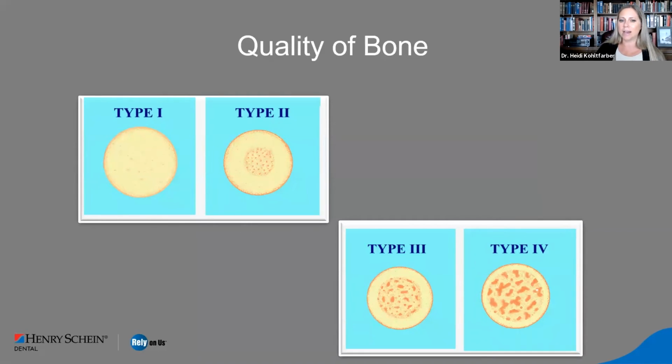Now, sometimes our CBCT units will have something called HU for Hounsfield units. Really, because of the physics with CBCT, we do not have true density with our CBCTs. That's really looking at gray values, where with medical CT, we do have true density. And so we can use those Hounsfield units to look at bone over time, bone gain, bone loss, that sort of thing. With our CBCTs, it's important to realize that we really haven't gone beyond the visual inspection.